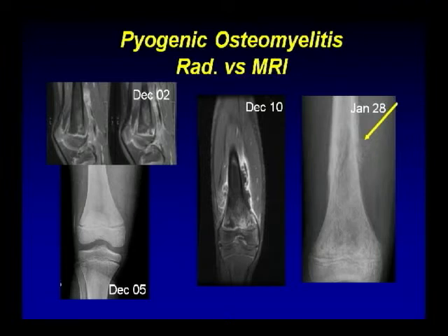And then when you go back to the radiographs, which were obtained 6 weeks later, then you actually finally see changes within the periosteum. You see periosteal bone formation, and again it looks a little bit calcified. This is already more showing you a subacute phase. So this is not an acute phase anymore, this is subacute. At that time the patient was already treated. And also please note in this patient that we have a pathologic fracture, which you see nicely in the diaphysis.